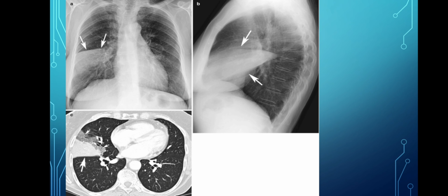Next, this is a diagram of a chest taken in PA view, which shows underexposure. All the rib cages are normal, the clavicle is normal, the costophrenic and cardiophrenic angles are normal on both sides, the trachea is in the midline, and the cardiac shadow is normal. There is no cardiomegaly, and the left-sided lung field is quite normal.